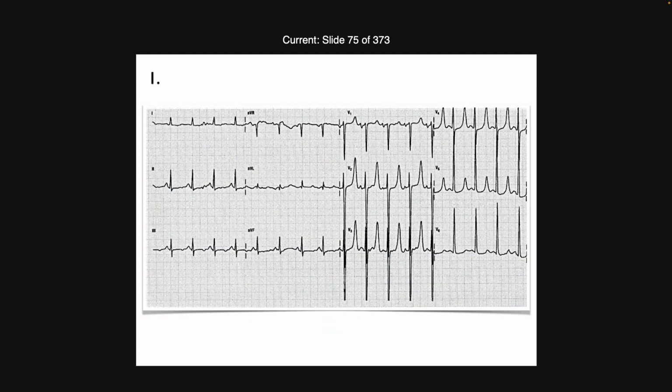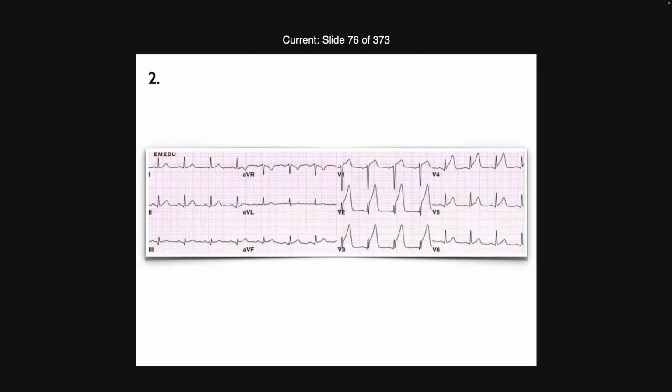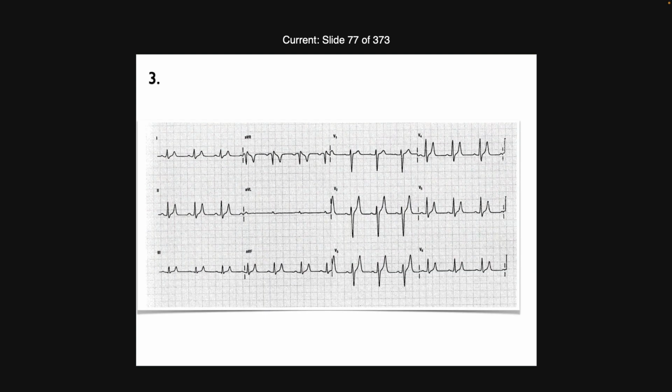Riley, number 1, state if it's hyperacute or hyperkalemia. I think hyperkalemia. I think so too. Okay, Kyle, number 2. Hyperacute. Okay. And number 3. Peaked. Yeah, so hyperkalemia.